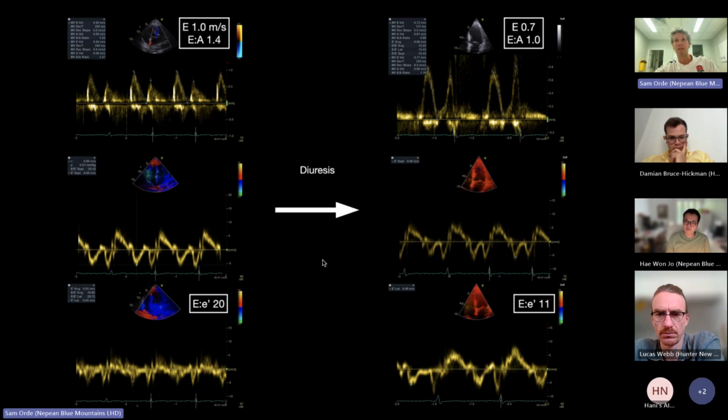And that's, I guess, my new big bugbear: if we're going to start nitric oxide, you've got to check this out. The clinical team, who were looking after this patient, were going to put this patient on nitric oxide, but they hadn't seen this left atrial pressure estimate, which I felt was raised. I wasn't 100% sure, but I'm pretty sure there's lots of things, just like Haywan said, to suggest it was raised. And if you put someone on nitric oxide and you pulmonary vasodilate them, if you've got raised left atrial pressure, then you're just going to flood the lungs with that raised pressure, and you kind of open the floodgates so that this post-capillary pulmonary hypertension can then cause increased interstitial fluid in the lungs.